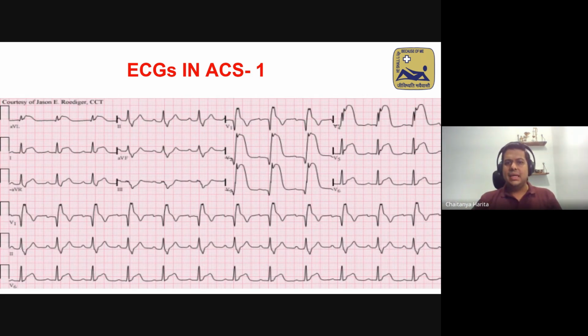And this is the classic ECG that you've seen. I put this up in the previous class, but this is the classical ECG that we see in this patient. So if you look at this ECG, as I said, the first step is always standardization. Your eyes should automatically drift toward the left side of your ECG to see that it is two big boxes tall and one big box wide.